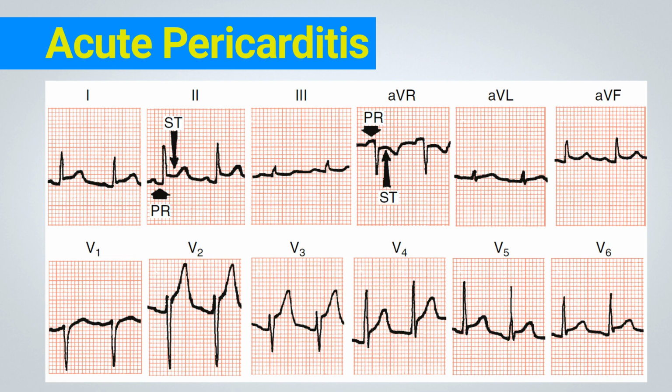A crucial point of differentiation between ST segment elevations in pericarditis and acute MI lies in their distribution. In an MI, these elevations are typically confined to the anterior or inferior leads due to the infarct's localized area. Conversely, the pericardium's role in enveloping the heart makes the STT changes in pericarditis more generalized, with ST segment elevations often observed in both anterior and inferior leads.